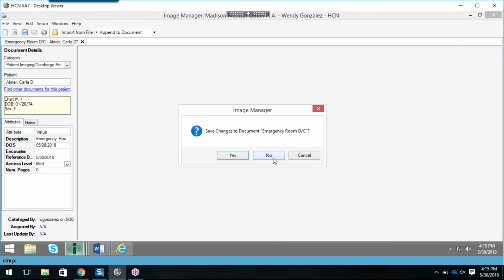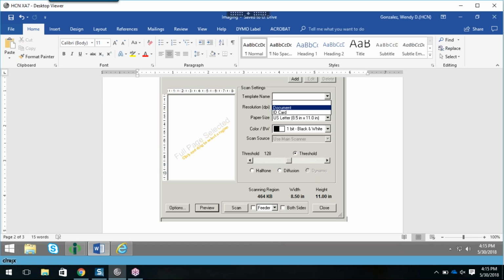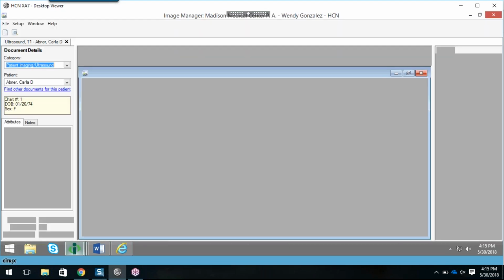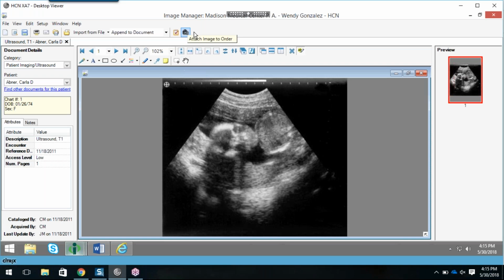After saving, something else happens. Let me pull up a scanned document here. After saving, you're going to see a couple of icons pop up. And I want to make you aware of these, as the second one here, which is the little camera. This one is newer here, or the little case, I should say, the briefcase.